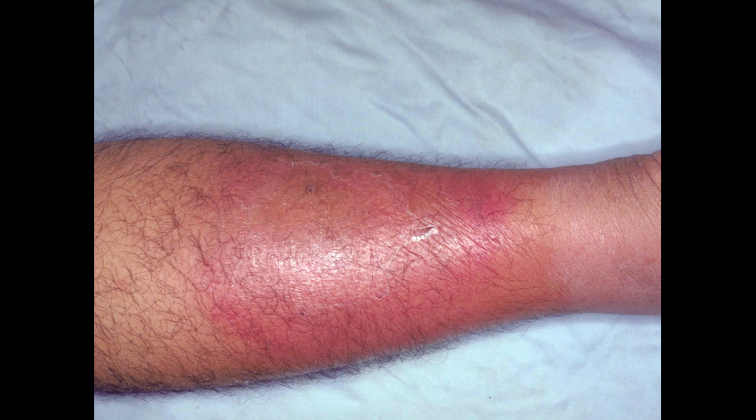But there's a lot of other things that can masquerade as this. And sometimes depending on how much subcutaneous tissue you have, you can hide an abscess down there. So the question is, is there something that I need to drain, or is this something that simple antibiotics can affect, right? Now, as we get going on the ultrasound findings of cellulitis, I think it'd be helpful to review a little bit of what's going on from a pathophysiologic perspective, right?